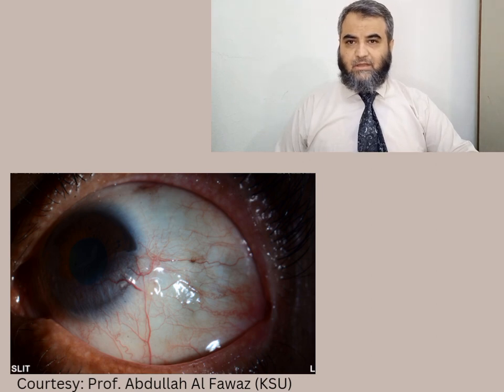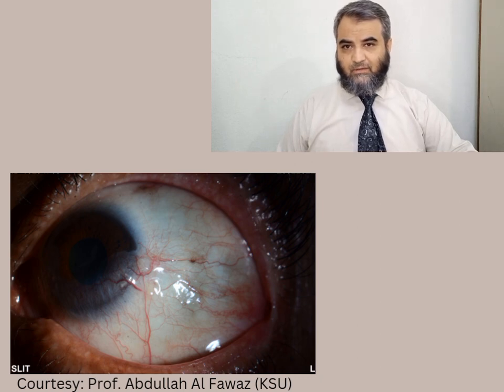This is the anterior segment photograph of the same patient taken from the infratemporal side. Here again you can see those vessels, how they are encroaching and progressing into the cornea. It is going up to the mid-level, and the visual axis is yet spared, not involved that much.